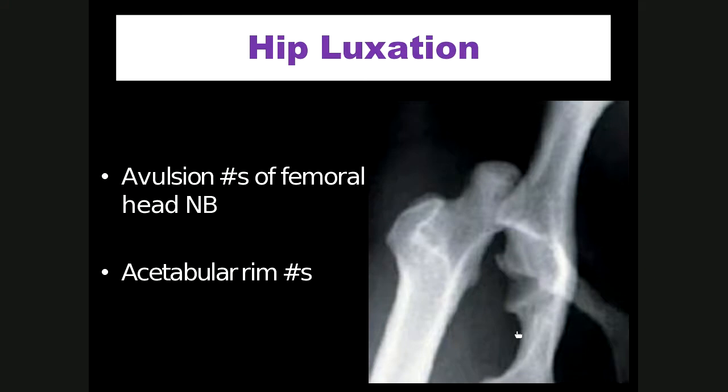In this radiograph, there is a triangular shaped fragment located within the acetabulum with a fracture bed within the femur head, consistent with a femoral head avulsion fracture.